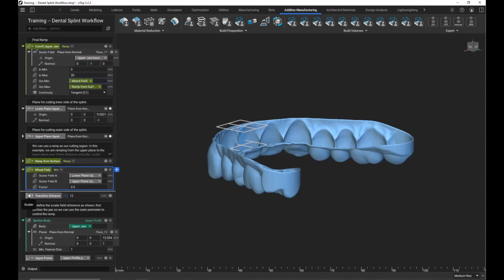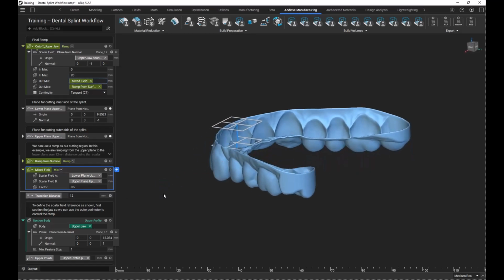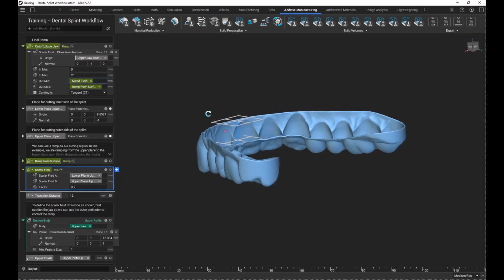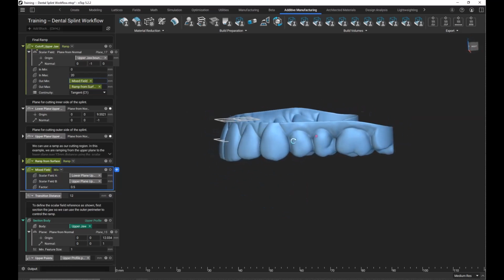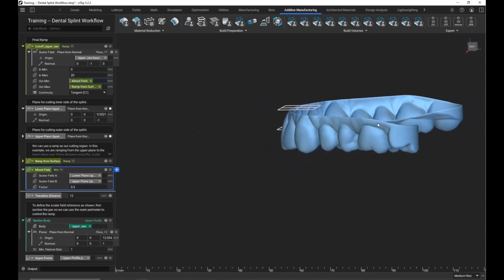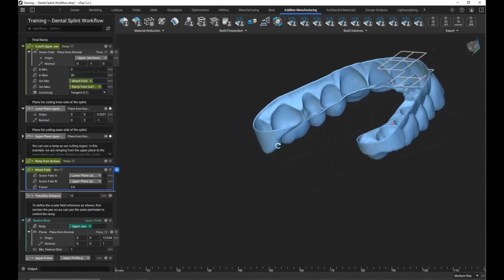So if you want to learn more about this topic, if you go inside this and you want to create something similar, I recommend first going into our fields course in nTop Learn. But that's the key thing, is that we're going from one plane to the next plane. So that's why we're seeing a ramp between the two. And then we also have one additional ramp, which is just a reference field that we're using to then, as you can see, adjust it in the edges here as well.